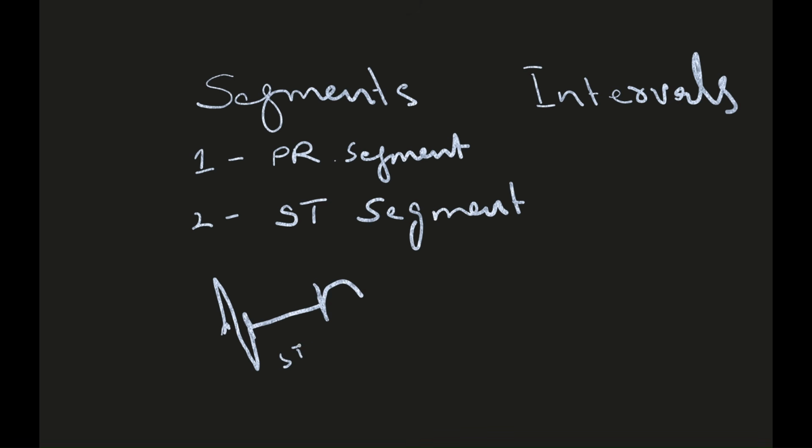This is your ST segment, and it is super important to remember because it is the single most important clinical criterion for the diagnosis of myocardial infarction.